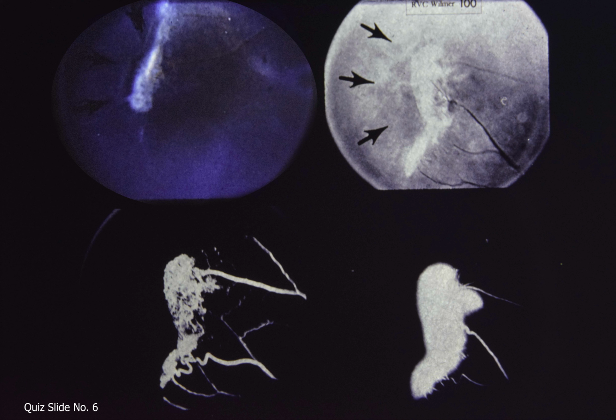The self-evaluation quiz was provided to assess your knowledge of the diagnosis and management of retinal vascular disorders, including fluorescein angiography interpretation. You may use other slides in this series in a similar self-evaluation by making your diagnosis before listening to or reading the descriptive material.